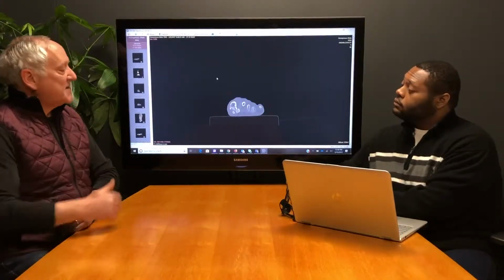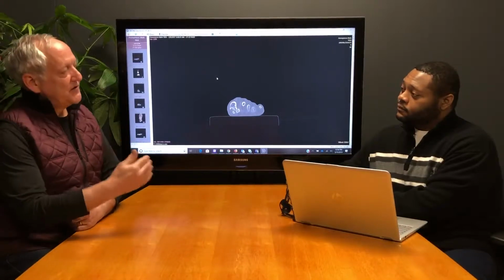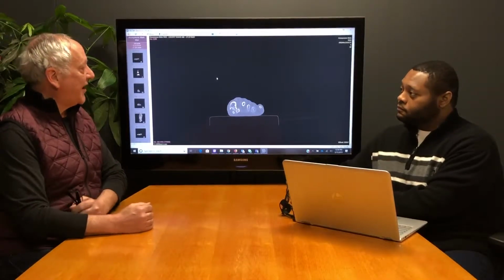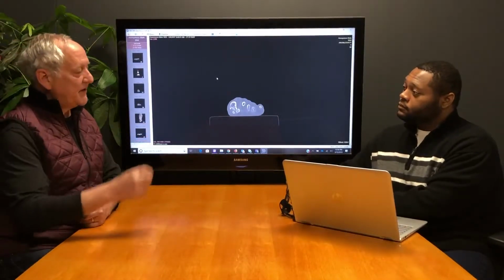I see. So now let's take the example if I have a particular individual colleague, another physician that I want to share the study with so that they can go over it with me in real time. How would I share it specifically with an individual?